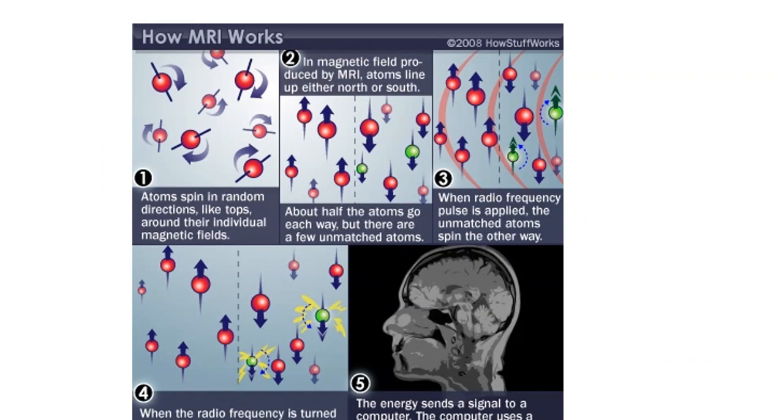That's pretty remarkable. It's not great for bone because bone doesn't have a lot of water in it. It's got some fat in it, but MRI is really good at outlining the anatomy of soft tissues, okay? And they each have different weights of gray, okay? And white matter and gray matter are actually not white and gray on MRI. But you can see how you can see different areas within the brain. I'll show you an example here.